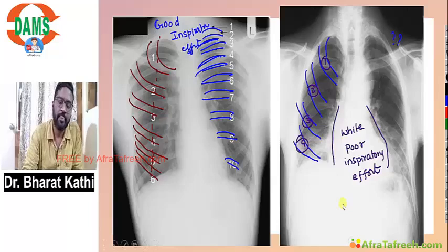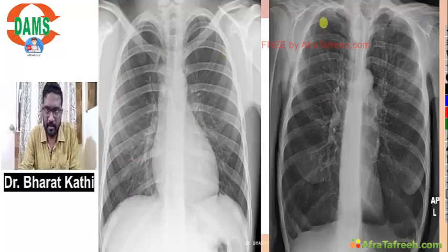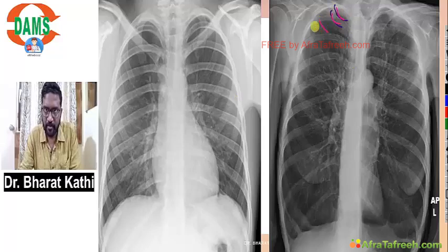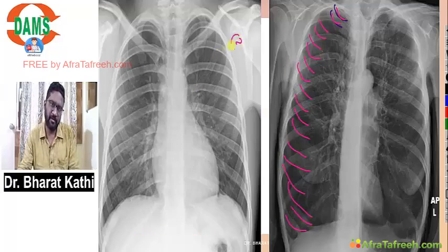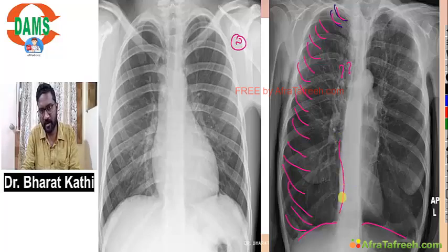Good. Then here you tell me what is the abnormality. If you notice 1, 2, 3, 4, 5, 6, 7, 8, 9. So this is a nearly normal chest X-ray. Now what is the diagnosis in this chest X-ray? Hyperinflated lung fields, flat diaphragms and tubular heart. So this is a hyperinflated lung field, suggestive of which condition? COPD, emphysema.